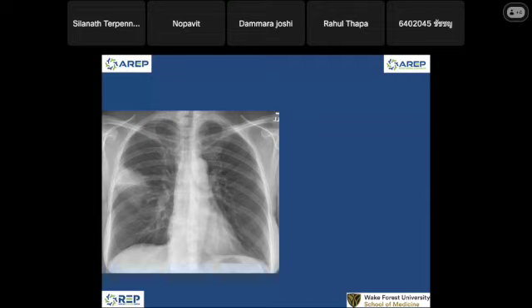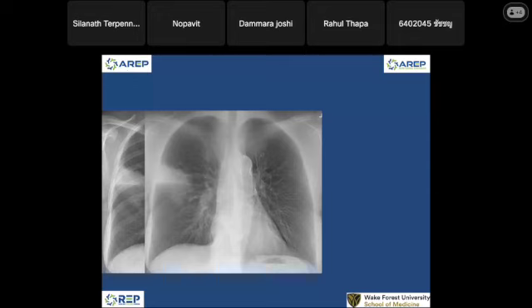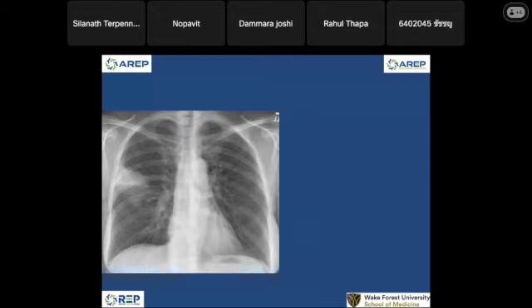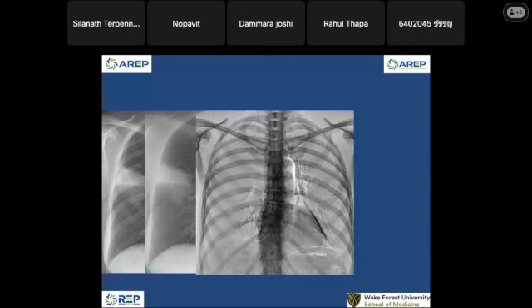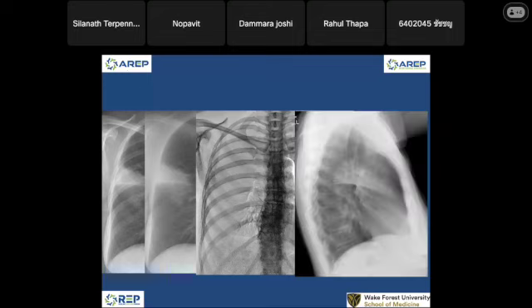Okay, look at the lateral, it may help. I forgot to tell you, when we do chest radiograph here, we have two more post-processing images. This is the routine lung image that we normally see. We will see a subtraction where we subtract the bones out, and another subtraction where we subtract the lung out and see only bone. So from one shot of the study, we process two more images, so we get 3 images from one shot. And then this is his lateral chest radiograph.